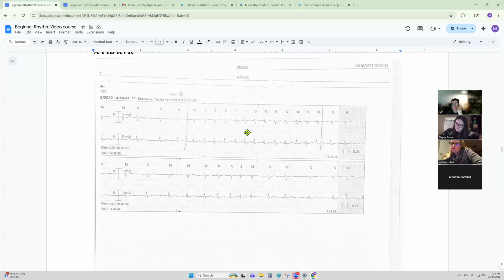Whereas if the contraction comes strictly from the ventricles, from that bigger, muscly part of the heart, that's where you get that bigger QRS complex, right? So, broad umbrella term SVT, narrow QRS tachycardia, sudden onset.